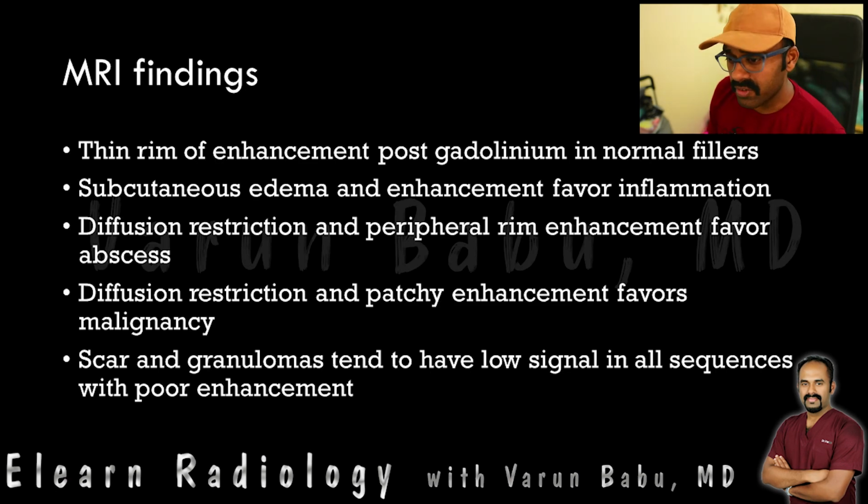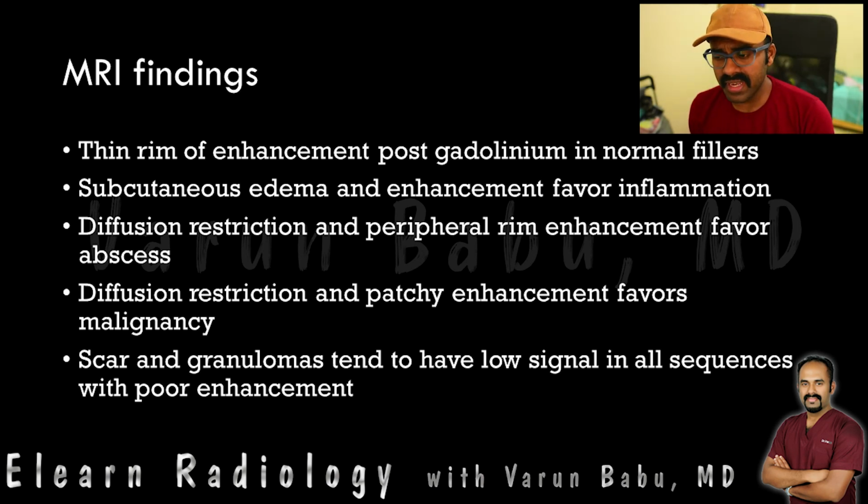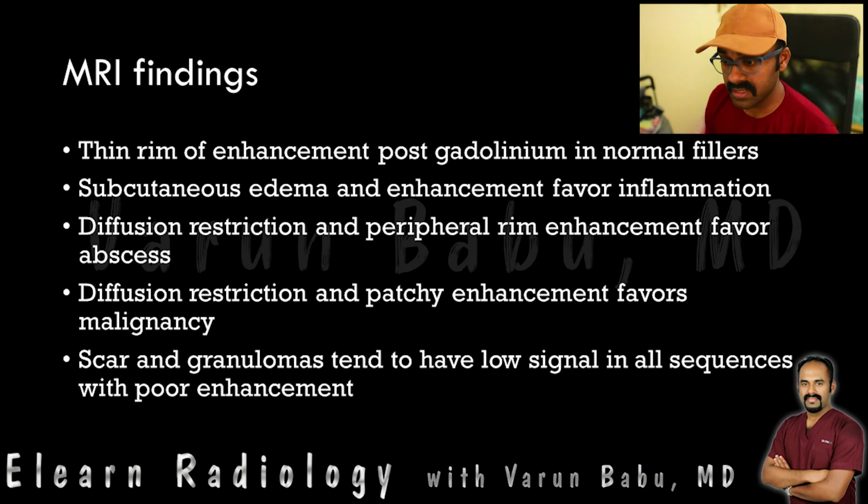Usually, if you're imaging normal fillers, there tends to be only a thin rim of enhancement around the filler post IV contrast administration. If there is some amount of inflammation around the filler, you will see subcutaneous edema and enhancement. If there is diffusion restriction within the filler and there is a peripheral rim of enhancement, consider abscess.